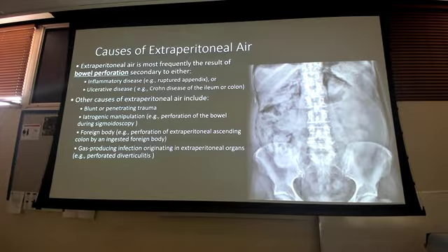Usually your blunt penetrating trauma. The biggest difference is look at what the air is not doing. It's not rising. And whether I did this supine or upright, it's going to look the same. It's going to look the same.